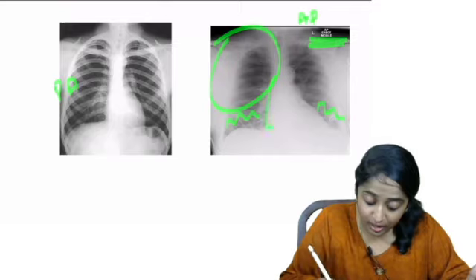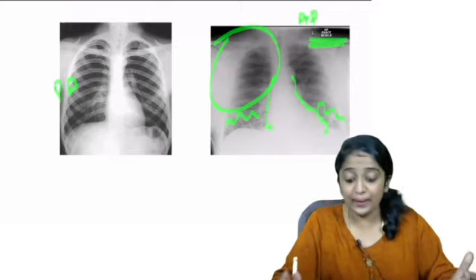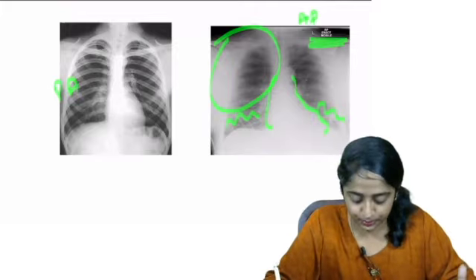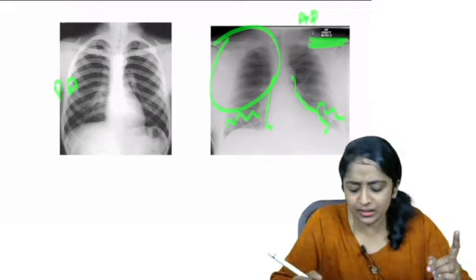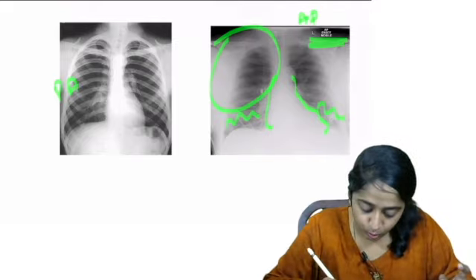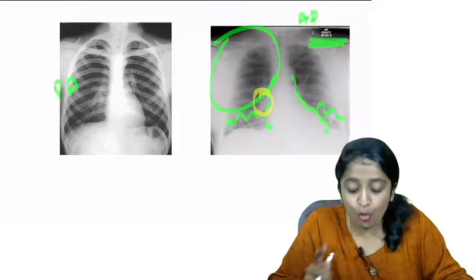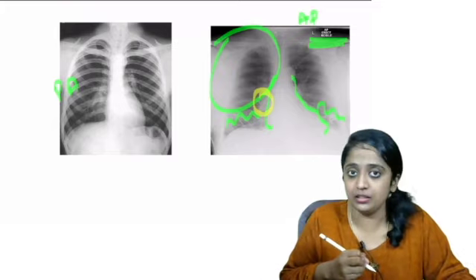And apparent cardiomegaly. It is apparent cardiomegaly. It is not real cardiomegaly. It is due to the magnification. You feel that the heart is enlarged. In addition, for people who are trained in reading radiographs, immediately one may note that the right hilum appears to be prominent. But before attributing it or stamping it as abnormal, look at the technical parameter.